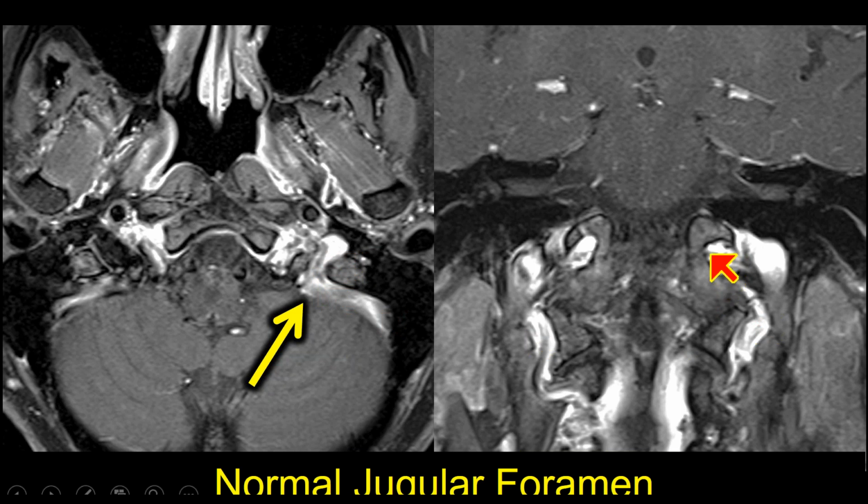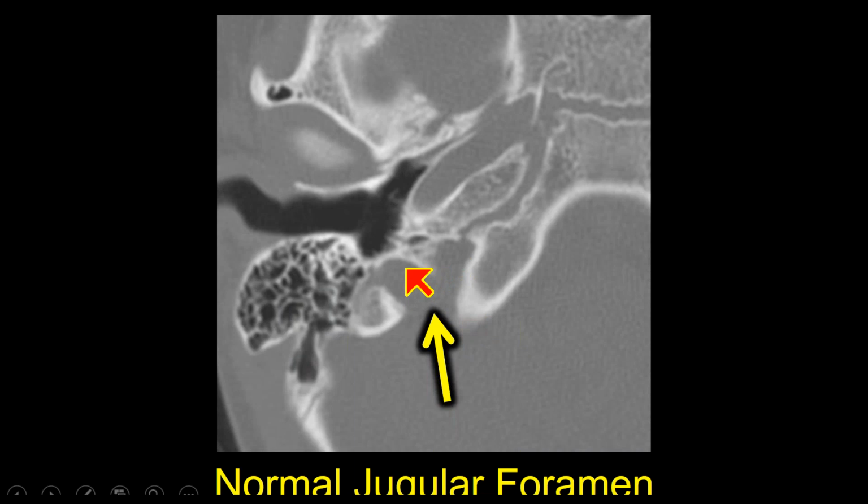And sometimes we see the non-enhancing 12th nerve coming out below the beak of the buzzard in the hypoglossal canal. So 9, 10, and 11 are all going over the head of the bird, and 12 is coming out under the beak of the bird. And we know that that jugular foramen is actually separated by that jugular tubercle into the pars nervosa and the pars vascularis. So that's very important anatomy of the jugular foramen that we want to think about.